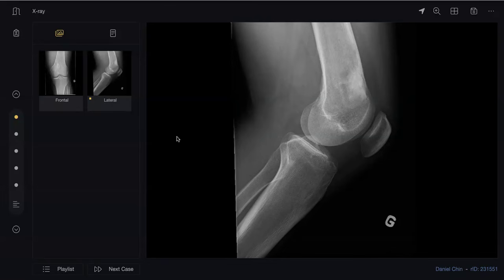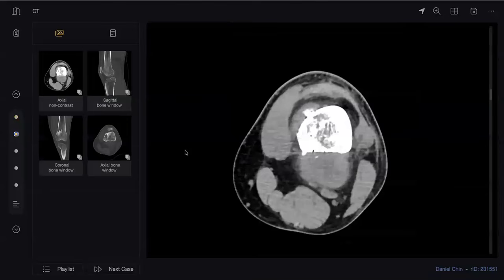Do you see any soft tissue swelling here? I see it a little above the sclerotic border. Do you see my mouse moving? Yes. So this is the soft tissue swelling. In the exam, you should show the examiner with your mouse. So this is the soft tissue swelling. And there is no joint involvement here. Describe it.